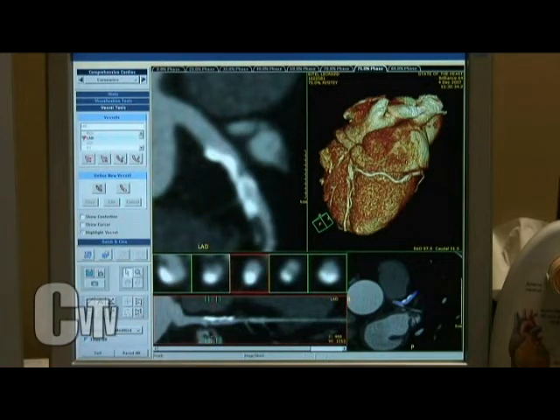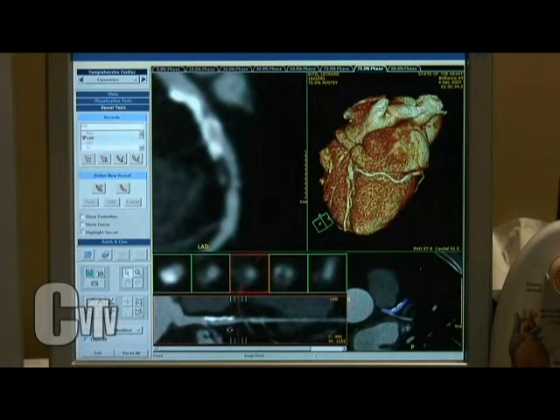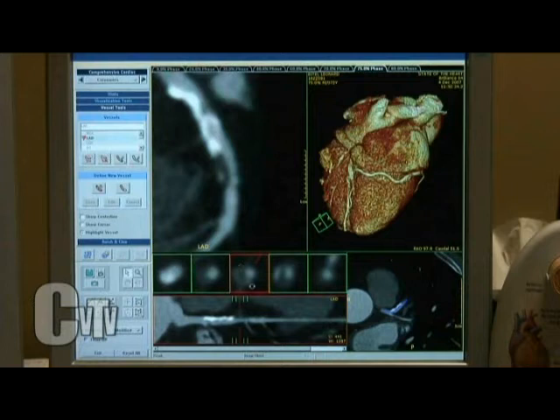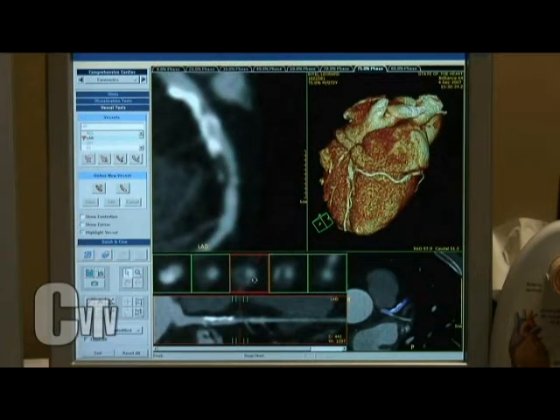It's more like cement. As we move further down this blood vessel, we leave the calcified plaque, and now we're heading into the new plaque. And you can see here, what's amazing, this white is the channel or the lumen. All this stuff out here, this gray stuff, is how big the vessel used to be, and all of that is lipid or cholesterol. Wow.